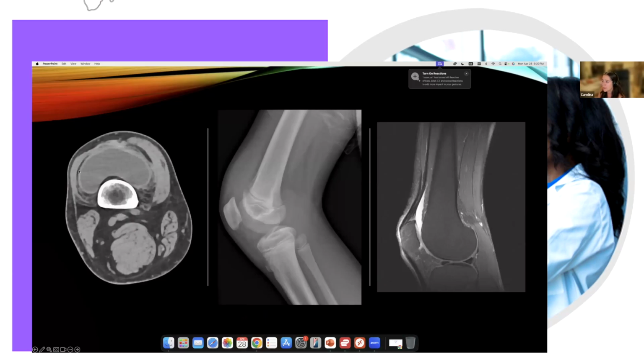And this is what an effusion looks like in a CT. This is an axial view of the effusion. I wanted to show you the bursa. There is some fluid filling in there. This is how you see it on the X-ray. This is a lateral view of the knee. This is the X-ray, and this opacity is what you see, and it displaces this fat pad. So you should have a brighter, a little bit blacker line around here like this. And this is something that is getting in between this fat.